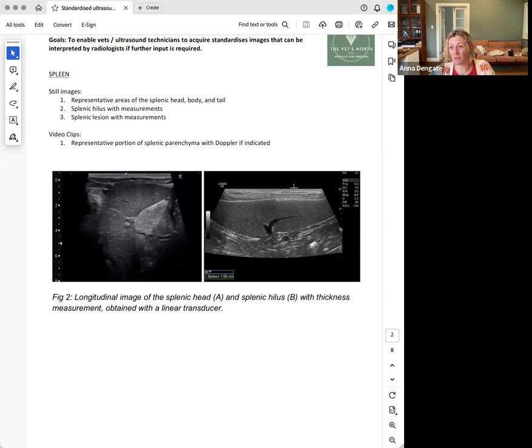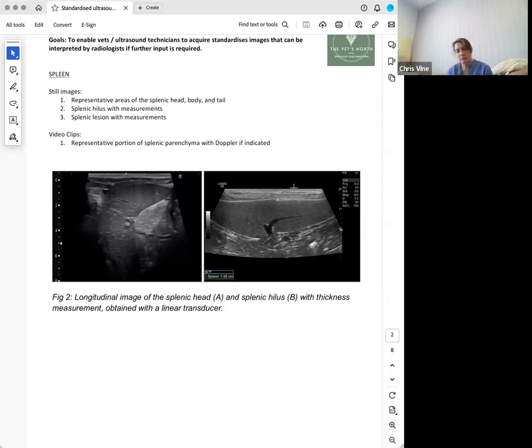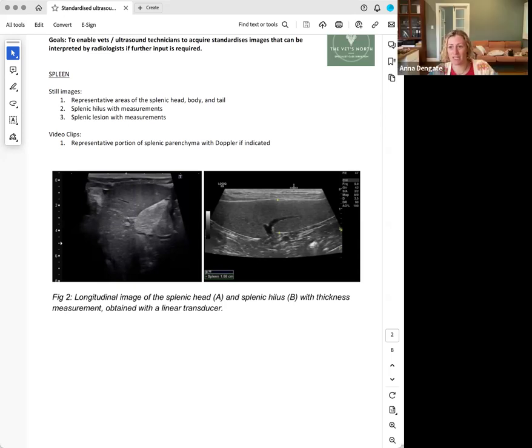And if it's bulging the capsule, whether it's hyper or hypo, I'm more like, let's go to surgery soon if it's hypo and bulging the capsule. Everything else, we don't really know what the significance is. If it's within the body of the spleen, not causing any distortion, it's probably not aggressive, but pretty much my recommendation is always to check it again and see if it's progressive, regressive or stable.